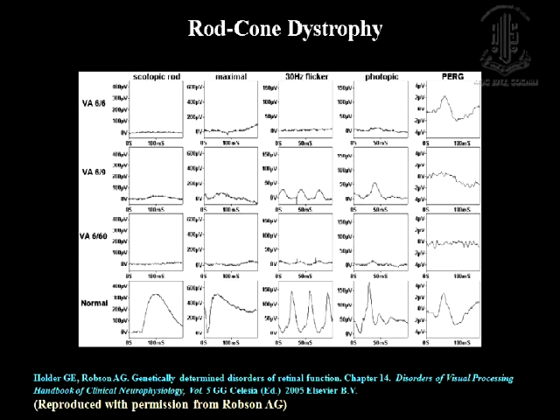Whereas if you see this patient has 6/9, a relatively good visual acuity, but again the rod systems are gone, but the cones show some amount of activity, but the PERG is also quite flat. This is the normal pattern ERG that I'm showing down. These are all for normal patients.